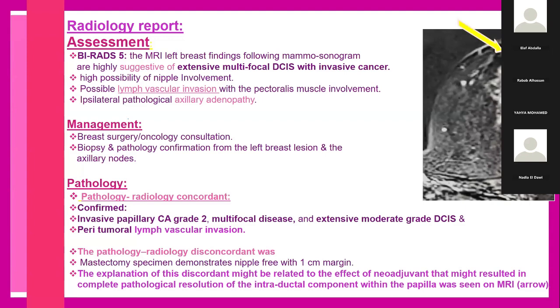The radiology report suggested extensive multifocal DCIS with invasive cancer, which has been proven, and also raised the possibility of lymphovascular invasion and involvement of pectoralis muscles along with ipsilateral adenopathy.